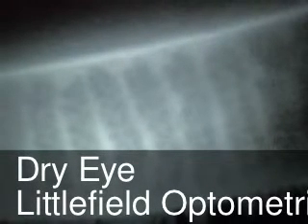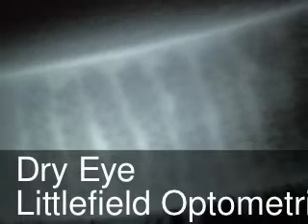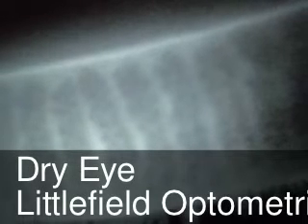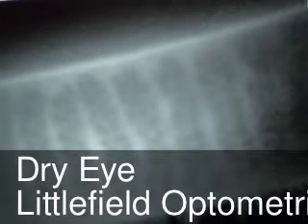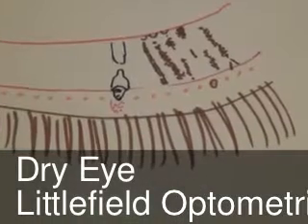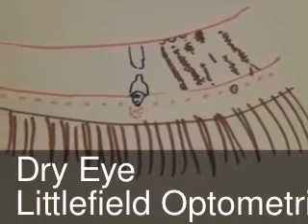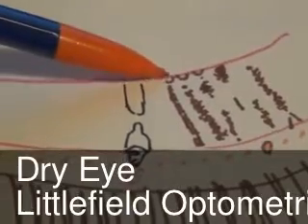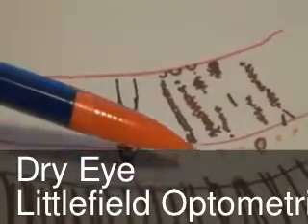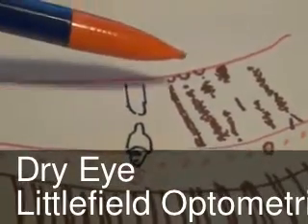In illuminated meibography, the meibomian glands look darker than the background, and this is opposite in infrared meibography, where they look lighter. Healthy meibomian glands are regular, long, and of even thickness, and do not cause sinking of the palpebral conjunctiva as here, or have sunken orifices as here.